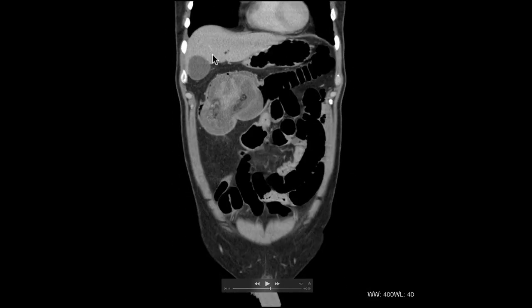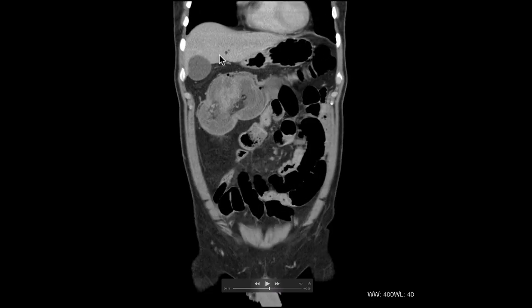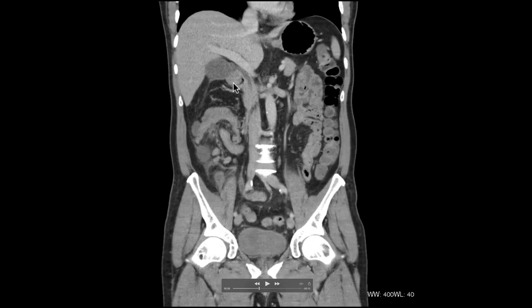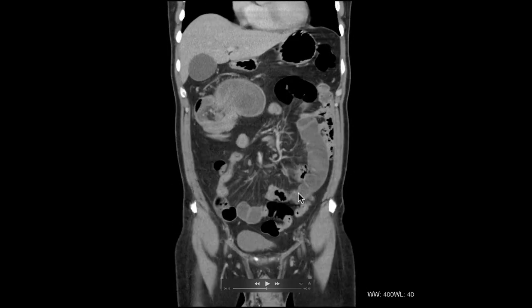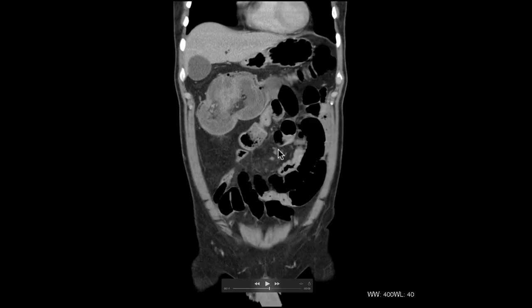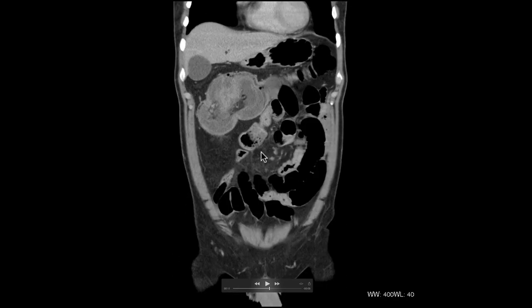And again, a quick look at the liver there, just to make sure there's no metastasis, especially in that left lobe, where it's a bit tricky to see. And the small bowel looks a little bit more blown up on there. There are a few loops that look quite prominent, so maybe they are intermittently obstructing, which wouldn't be surprising really, given what that looks like.